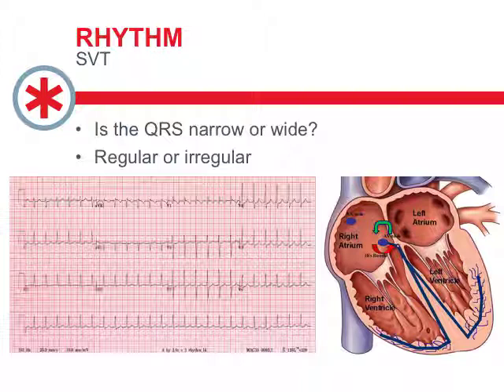And a supraventricular tachycardia just means that there is an electrically reentrant loop, usually around the AV node, where basically a beat goes down, it goes to the ventricles, but then also circles back up into the atria, and then goes back down the AV nodal loop again and drives the ventricle again. So these often end up around 150, 160 beats a minute. They're narrow complex and super regular, and that should give this away that this is most likely a supraventricular tachycardia.